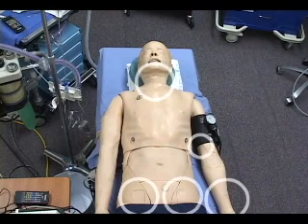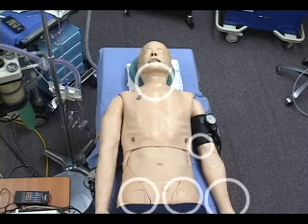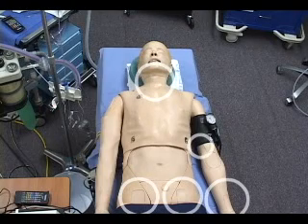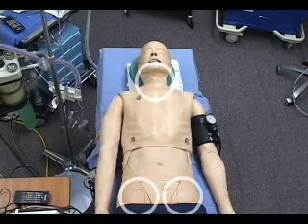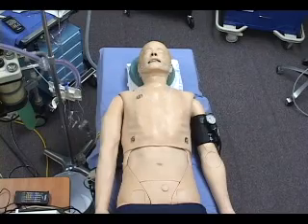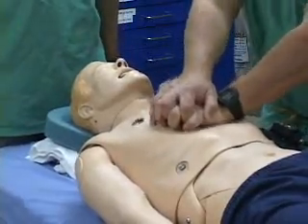The pulse strength will vary in response to falling systemic blood pressure and can be either normal, weak, or absent. Radial and brachial pulses disappear first, then femoral pulses, and finally the carotid pulses. The carotid pulses can be palpated during chest compression.